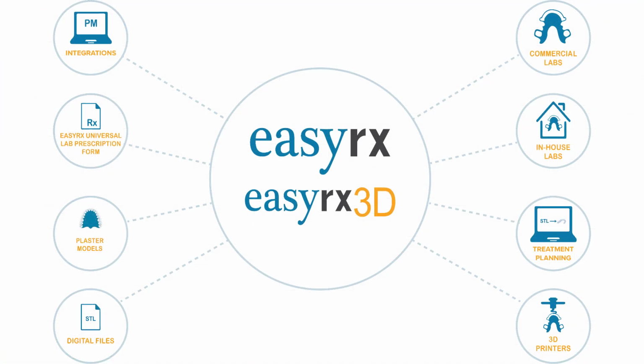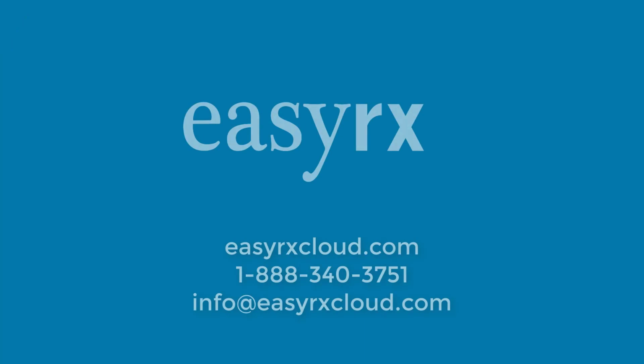And that's EasyRx. Well, a broad overview anyways. From submitting a case to a commercial lab or in-house lab, tracking aligner cases, editing 3D models in EasyRx 3D, managing all of your case information, and reviewing your practice statistics. There are many more great features to EasyRx that we can't wait to show you.